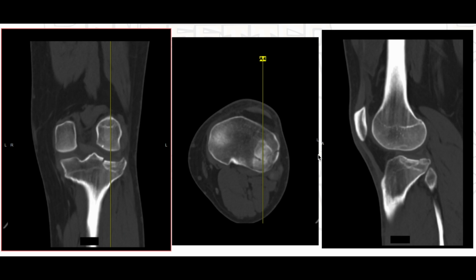So for those of you who said type 2, congrats, you're correct. So the reason you know this is type 2 is because there is this depression happening, which I showed you guys earlier, and there's a fracture line of the lateral tibial plateau. So because there's both of those factors, it's going to be type 2. If you had just seen a fracture with no depression, it would be type 1. And if you had just seen depression with no fracture, then it would be type 3. But because there's both, that makes it a type 2.